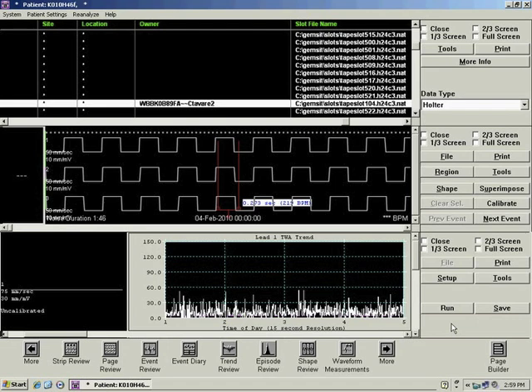Precordial leads are best for TWA analysis in most patients. Limb leads are known to contain large amounts of motion artifacts, and TWA in these leads should be interpreted with caution. When cardiomyopathy or channelopathy such as the long QT syndrome are suspected, which result in diffuse change in myocardial substrate, all 12 leads should be closely monitored.